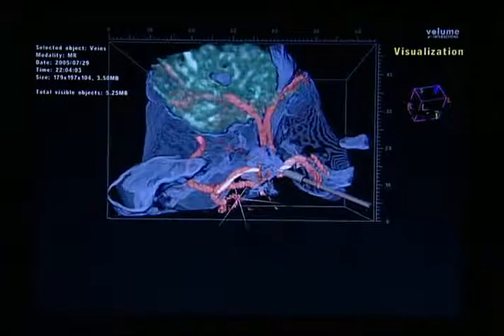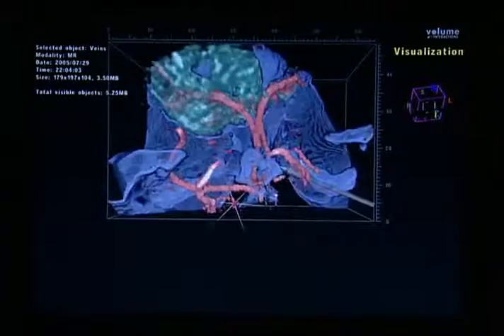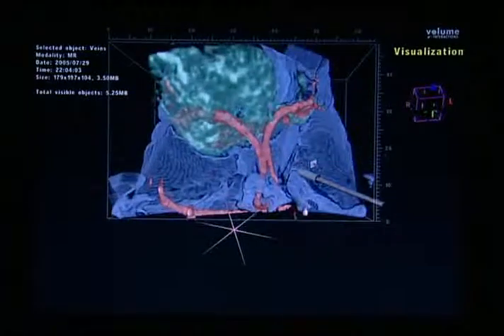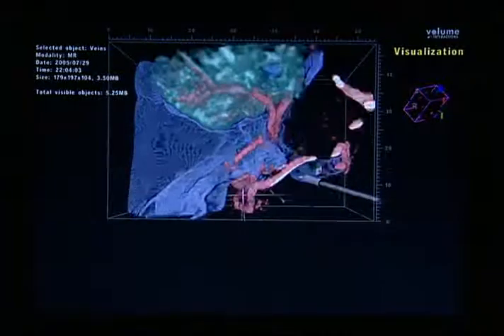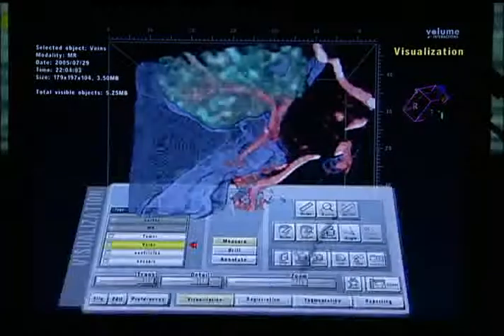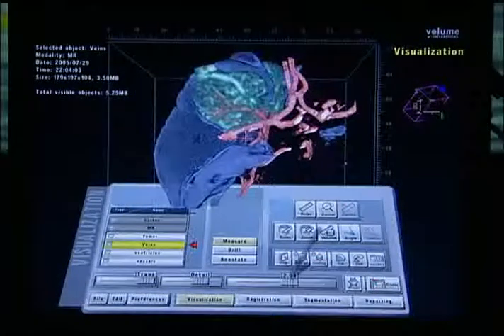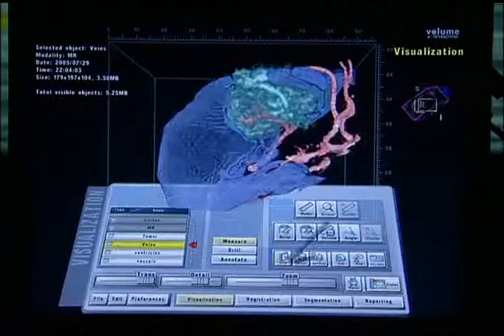You may get some impression of some of the vascular supply to this tumor. So you can get somewhat of an idea looking at this as to what this tumor looks like, which I'm not sure is completely self-evident when you're just looking at the coronal and axial images.